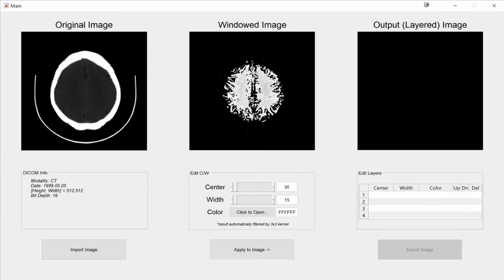And then after all of this layer selection and normalization, a 3x3 kernel is used to take out noise. That's a built-in function of MATLAB, and it really helps because once we start colorizing the image, having pink noise is very prevalent on a black background.